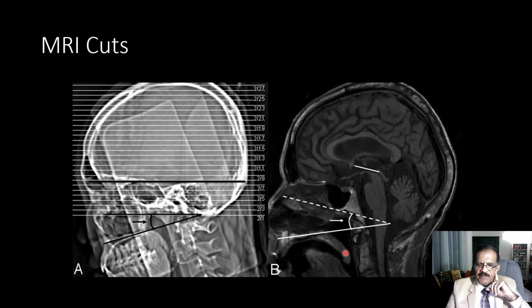Okay, this is what I meant by guide. You see these lines. Typically, when a CT scan of the brain is done, multiple slices are cut. These lines are representative of various slices, usually from below upward. This will show the base of skull. As you move up, you see more bone structure, and then when you are above this point, you will be seeing just scalp and then the soft tissue brain.